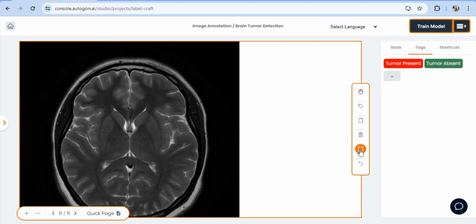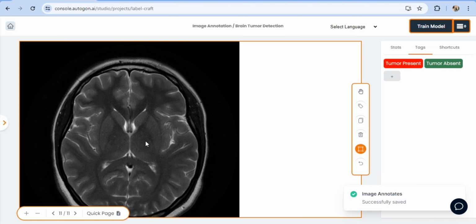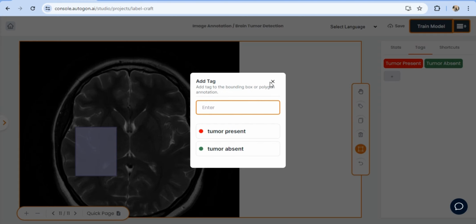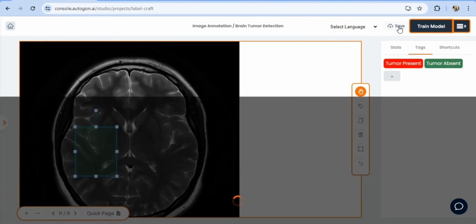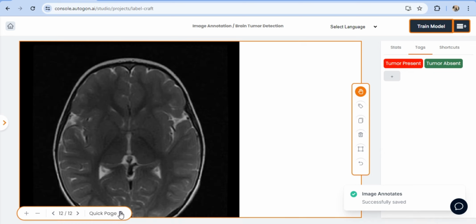Well, this is a clear scan. Now this is the very first clear scan. Like I've always mentioned, make sure you save as frequently as possible. Well, now I can pick a lot of sites here because this scan is pretty clear, so we can pick as many sites as possible. Okay, I want to pick one more site here. The scan is really clear. Okay, let's just pick more.